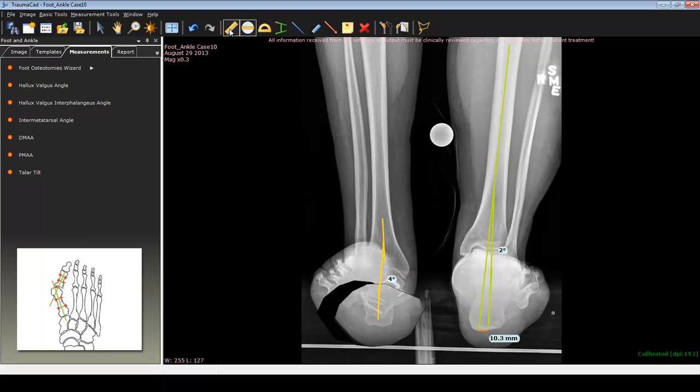If we also take our ruler, we can measure that we would reduce that deformity, which was 30 millimeters, by translating it about 18 millimeters, we would have a more normal position of the calcaneus, which would be still about 8 millimeters away from the long axis of the tibia. So a very good way to demonstrate how this deformity can be corrected and different ways in how to perform the osteotomies and where to perform the osteotomies. A very powerful teaching tool.